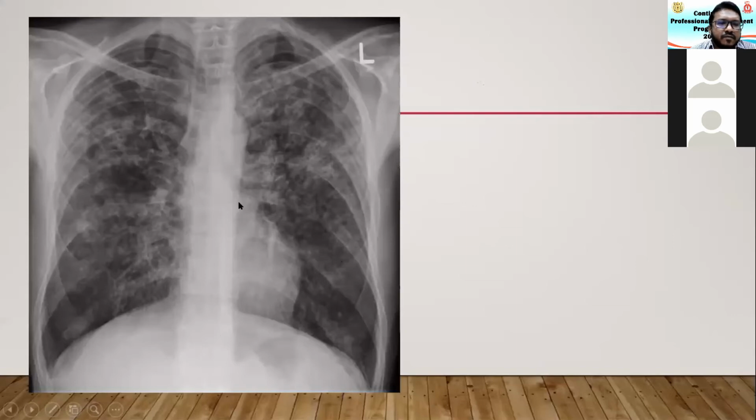So there are various ways of finding out which type of fibrosis it is. But if you look at this, there are diffuse changes on both lung fields with streaky shadows, with thickening of the interstitium, not the alveoli, not the air spaces here. So it's interstitial pathology here. And if you see diffuse thickening like this and chronic SOB, it's lung fibrosis.